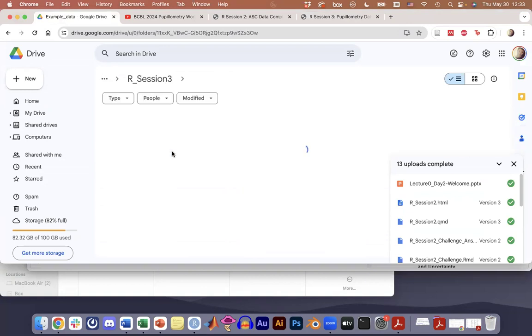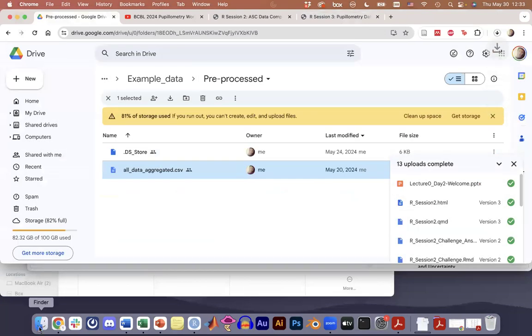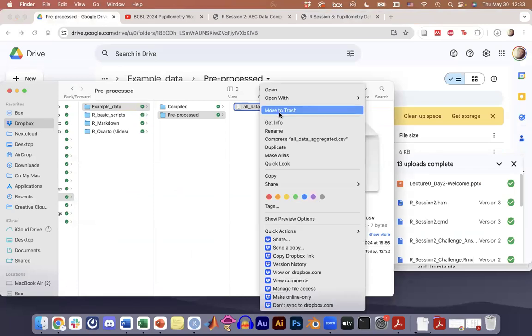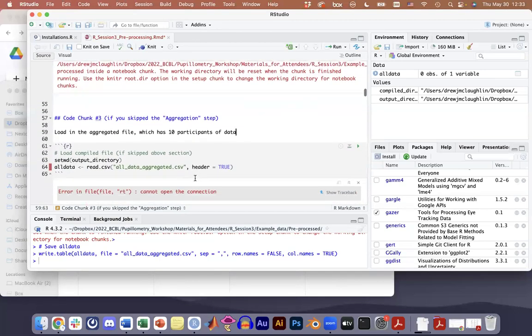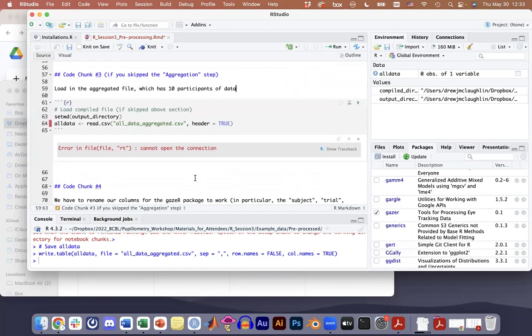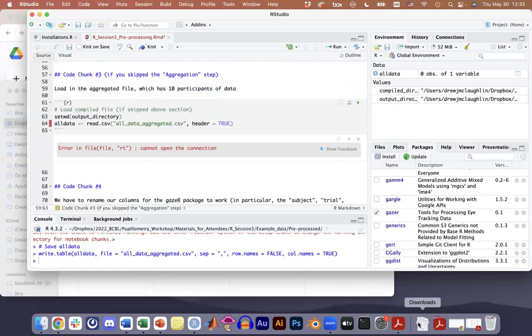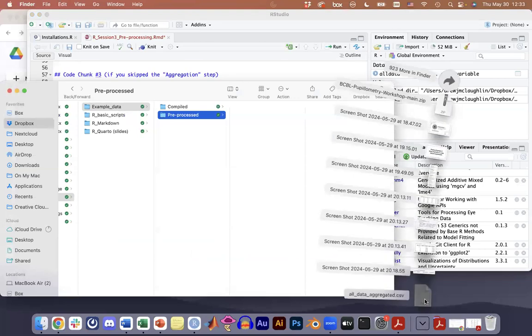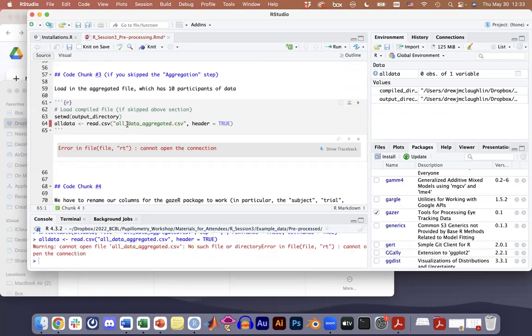I overwrote my data. Download a new copy.